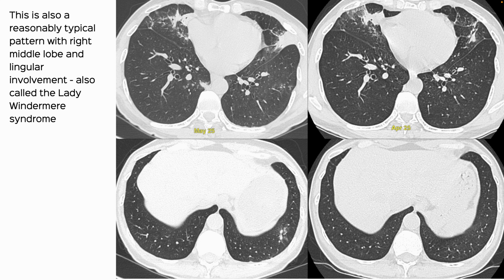And this was also unchanged over a month, but it was unchanged for almost 7-8 months with another CT scan earlier, which I don't have right now. This is also called the Lady Windermere syndrome, and maybe you all can read up about it. But I will, the next time I see something similar, probably put up a post or talk about it.